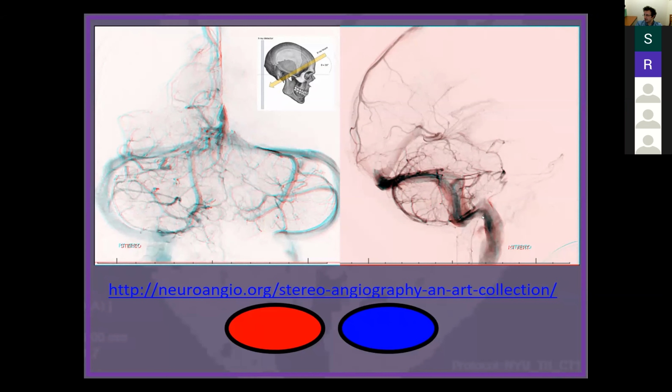You see a little bit of a thickening here compared to this. This is the cervical cord, anterior cervical cord vein, posterior. Here's the medulla, and that goes up. That's the pons, and that's the mesencephalon. Back here, you have the precentral cerebellar vein, and that, again, is in the quadrigeminal cistern. So that marks the posterior border of the brainstem.